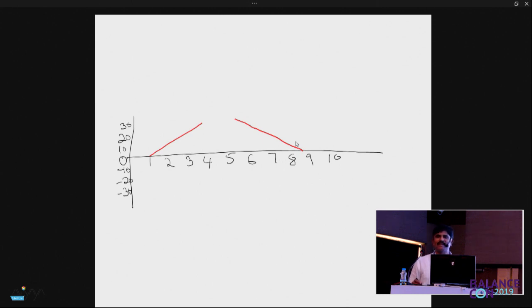From where did it go left? This 0 degree tells that you are looking straight ahead. All these are a little rightwards, more rightwards, and more rightwards. This is leftwards, more leftwards, and more leftwards. So whatever is at 0 is right in the center.